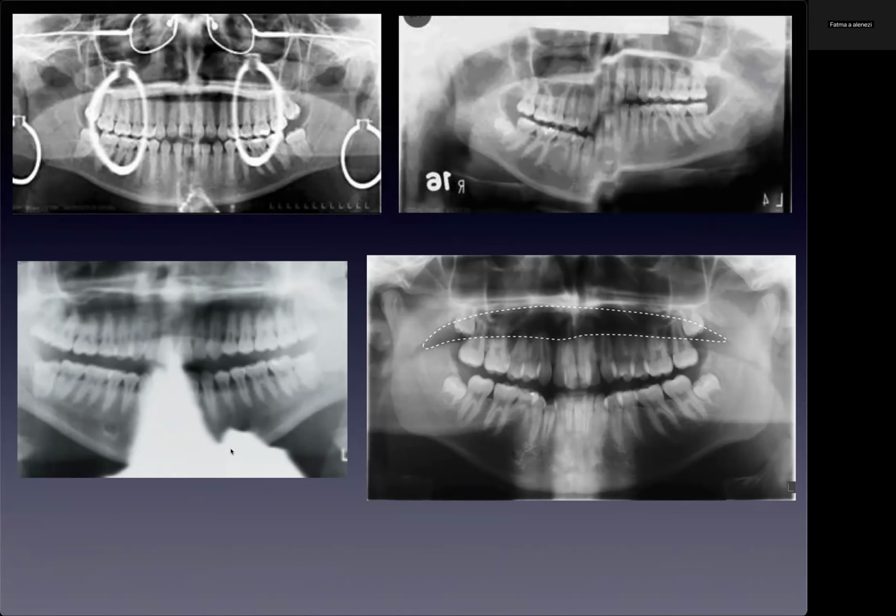Thyroid collar. Yes, thyroid collar, excellent. And over here, this black burnout area, does anybody know what that is? We talked about it a second ago. When we asked the patient, the tongue is not on the palate. Very good. The tongue is not flat on the roof of the mouth, which means we have an airspace between the palate and the tongue. Excellent.